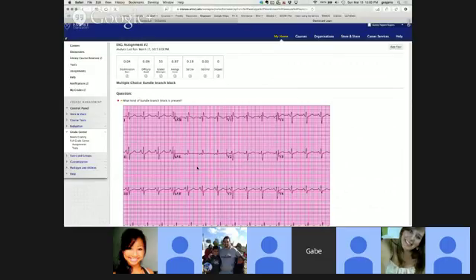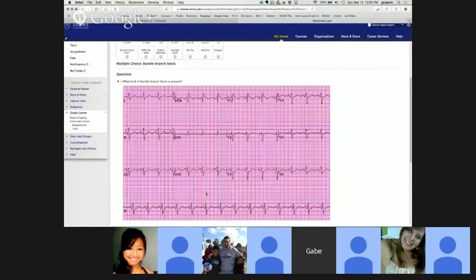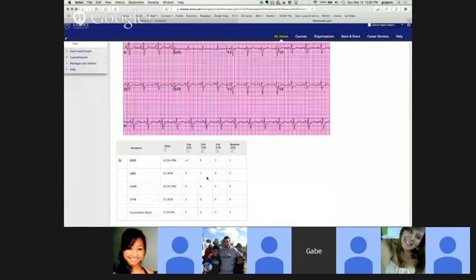Yeah, you could possibly say that because this is positive in 1 and slightly more negative in aVF, there's left axis deviation consistent with a hemi block. In which case, an answer choice that said something like right bundle branch block with left anterior hemi block would be right. But I didn't give that answer specifically. The answer choices were pure right bundle, pure left bundle, pure left anterior, left posterior.